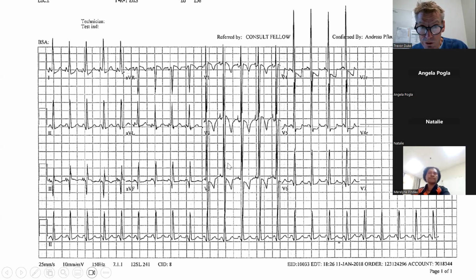But when you get to ventricular hypertrophy, it looks like things are rather deep here, aren't they, in V2? So 5, 10, 15, 20, 25, 30, 35. It's hard to see the end of it, so it's about 30 deep in V2. Remember, the S wave in V2 and the R wave in V5 is looking for left ventricular hypertrophy. So 5, 10, 15, 20, 25, 30, at least 30. So you've got RV5 plus SV2 around about 60. So there must be left ventricular hypertrophy. And then the question is, is there also right ventricular hypertrophy?